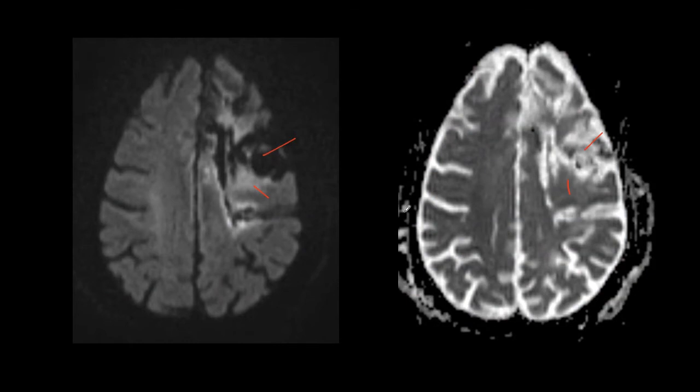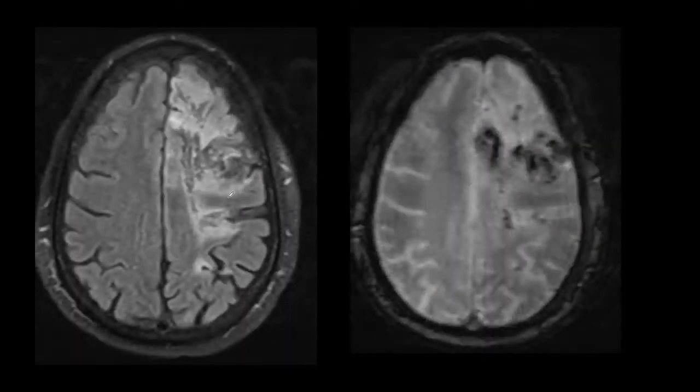And when it looks like it's mixed, where you do see some increased DWI but without decreased ADC, the most logical explanation is that it's going to have T2 shine through, which means increased T2 signal just shined through to the DWI, but it is not true restricted diffusion. And this patient ended up having decreased gradient signal.